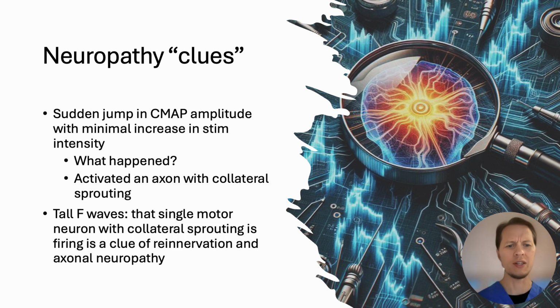What's another one? This is a neat one that I picked up. Tall F waves, right? Once you're hitting your F waves and you just happen to fire that one that has the reinnervation, suddenly you get a nice tall F wave. That's another sign of neuropathy. I get that here and there.